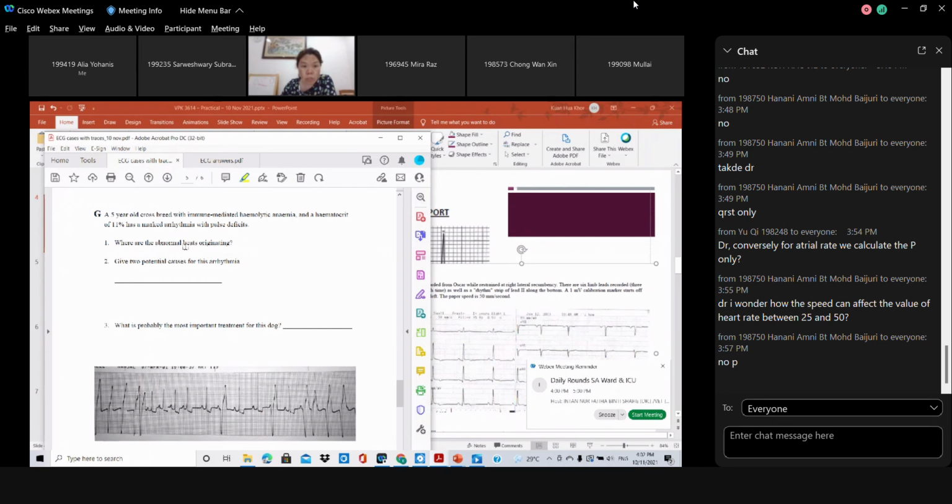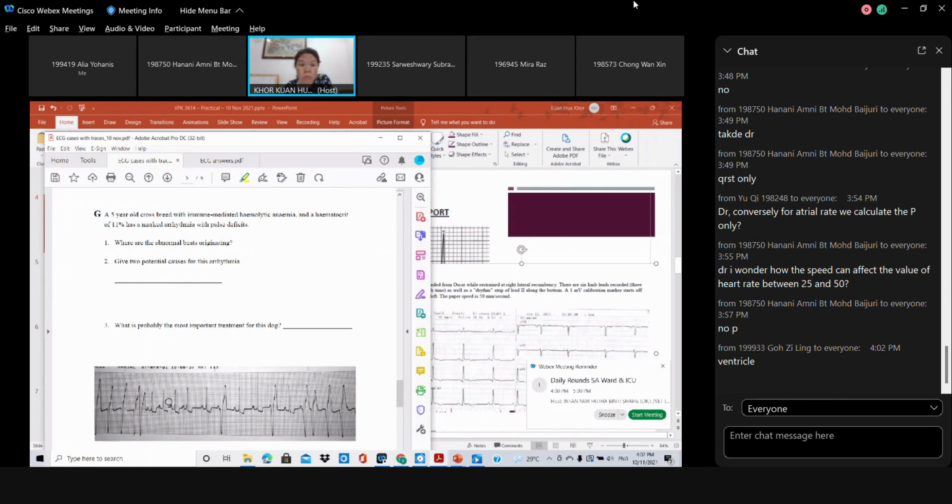So the origins of all these beats, where are they coming from? ST, doctor? ST? Why ST? Do you think these are all ST? The origin of all these beats, where are they coming from? Is it the atria or is it the ventricle? If you get all these bizarre beats, this one, this one, atria or ventricle? So the answer is ventricle. Okay? The answer is ventricle.